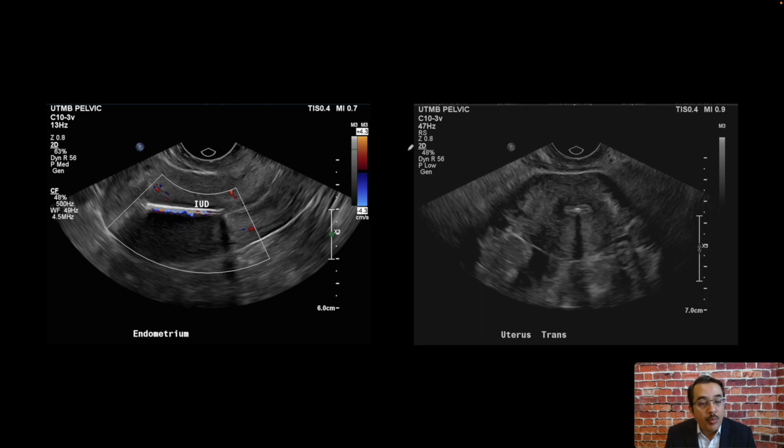The next patient had a pelvic transvaginal ultrasound to try to localize the IUD. The IUD is normal in position. It is usually seen as a linear hyperdensity extending from the fundus down. If it is more inferior in the lower uterine segment or the cervix, we call that abnormal. The linear hyperdensity also causes this shadowing, which is also seen here on the axial image.